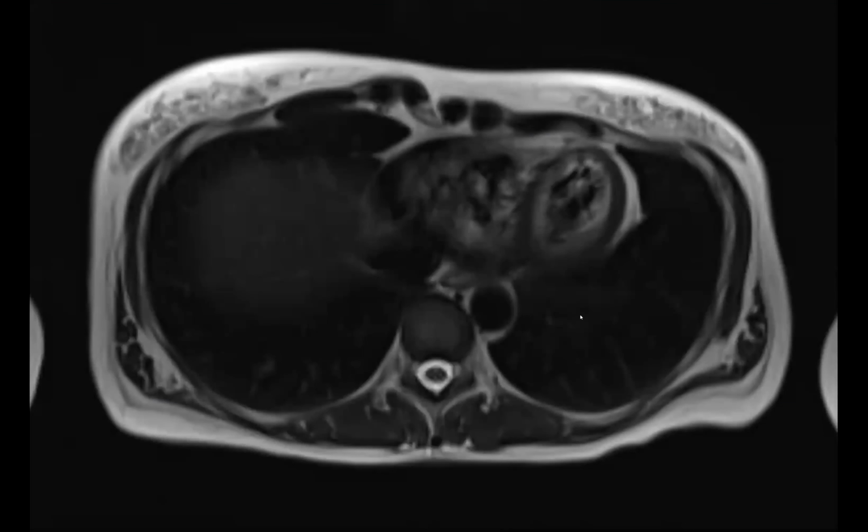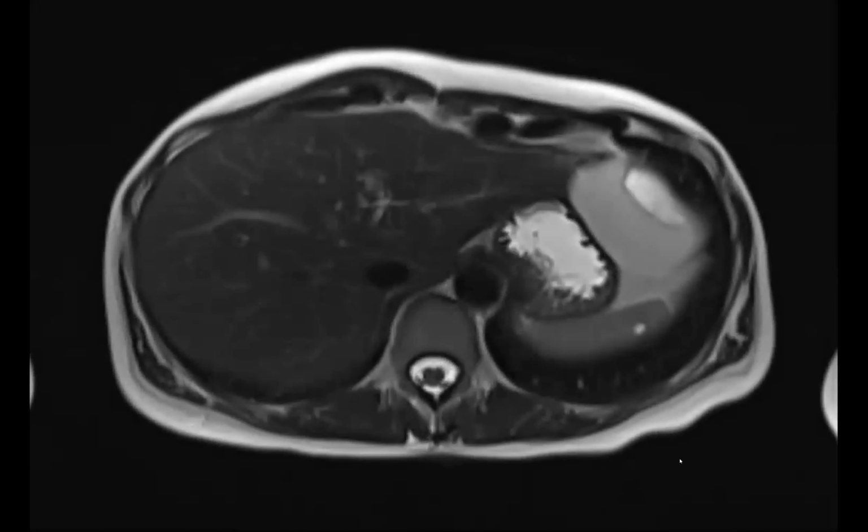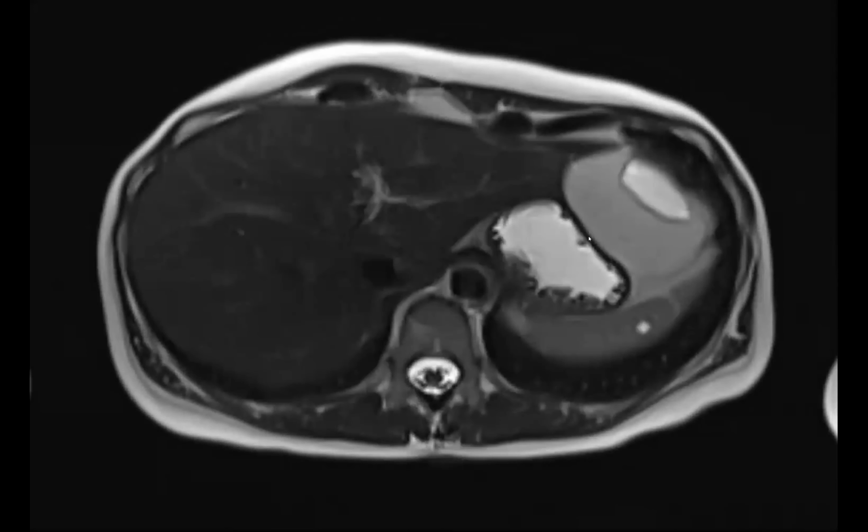Okay, so this patient got referred because they had some abdominal pain. They ended up with an EGD and an EUS. And on EUS, they found what they thought was a GIST tumor arising from the stomach. They did ultrasound through the stomach wall and saw a large mass, and it looked like it was arising from the fourth layer of the bowel, which is usually the muscularis layer, and called it a GIST and did a biopsy, and the biopsy came back sort of non-diagnostic. So anyway, here is the lesion abutting the stomach.